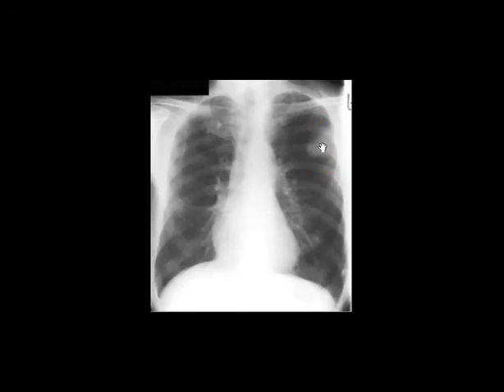You can find this. So how do you describe it? Try to describe it. Let's help you. Is it solitary or multiple? Solitary. And do you mention that it is a bony lesion or pulmonary? So I see that you mentioned that it's a bony lesion coming from the rib. So nice. Then the next will be, does it look aggressive or indeterminate?